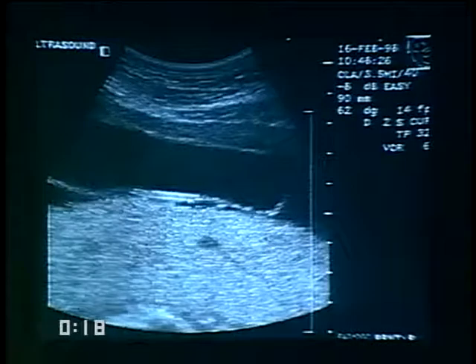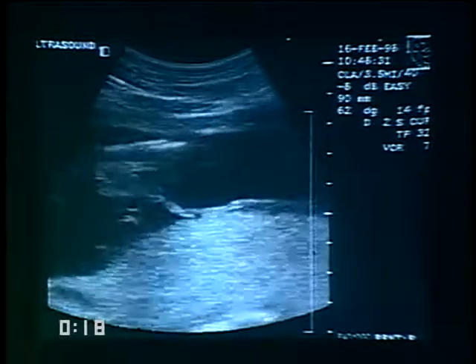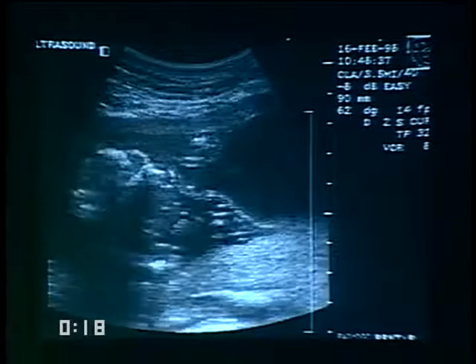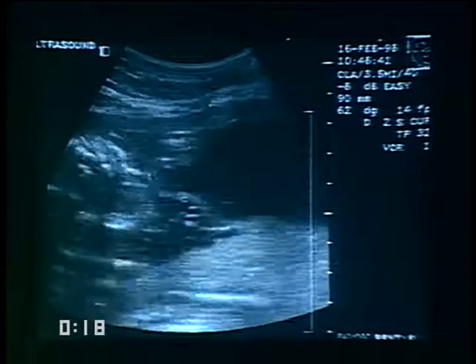Turned out that that was a fibroid. And here's another example of the bigger the anomaly gets, sometimes the harder it is to tell what you're looking at. We're looking here, and then we're looking out at this thing extending.